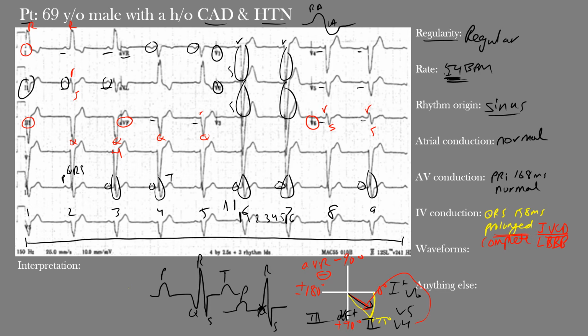Now the T waves are a bit broad here, but they're actually seen in left bundle branch block like this, okay? They're still asymmetric and appear normal in this setting, okay? So no T wave problems here. See, they're tall, but again, they are asymmetric and normal here. And that tends to be something we see, these broad T waves in left bundle branch block.